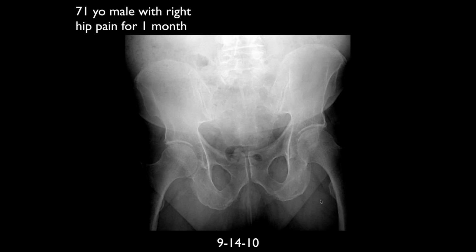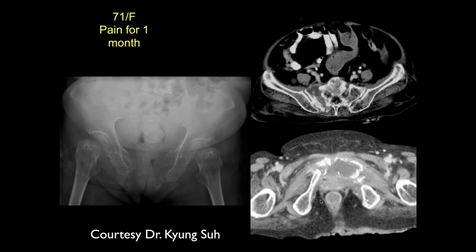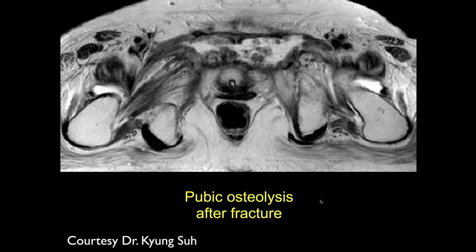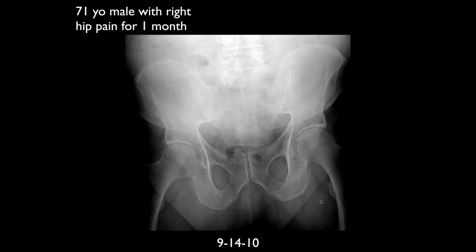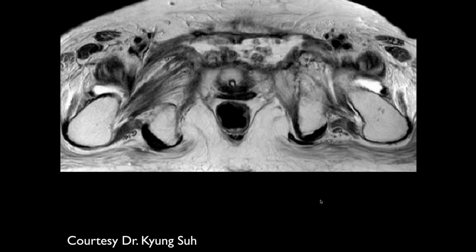Did they look like coxa magna on that one first right there, John? I think both femurs are rotated here. I don't think there's actually coxa magna. Okay, it just caught my eye. I thought there might be. Sure. Yeah. If you compare the hip here versus the one back there, it's kind of elongated. And I think it's positioning. Okay. Okay, Jennifer.